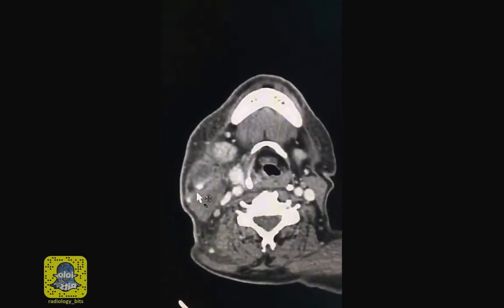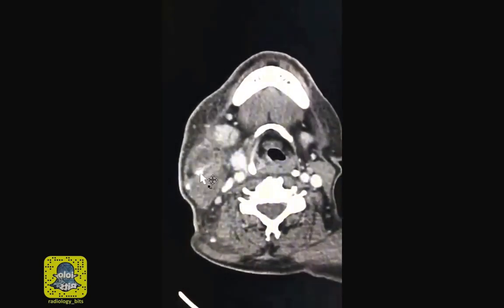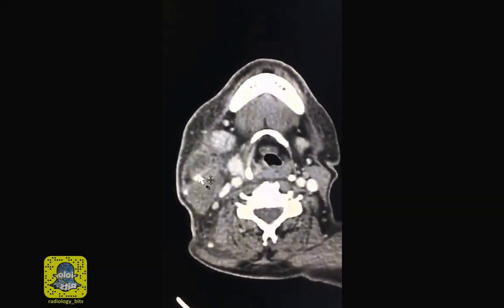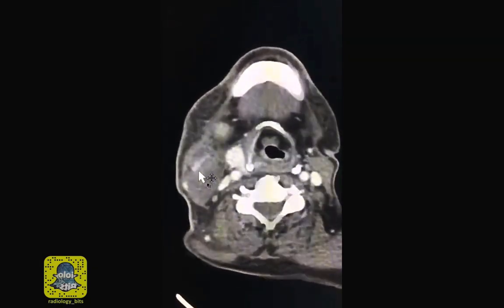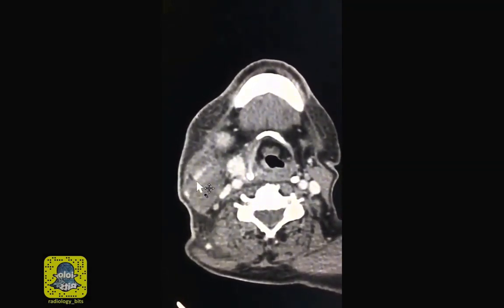Interesting finding is this very dense partial rim here in the inferior part of the abnormality, which could represent either calcification in the wall or milk of calcium, that calcium that deposits within the dependent portions of the cyst. Whether it's mural calcification or milk of calcium, this tells us that this is not a very acute abnormality. It has been there for a while for calcium to develop.